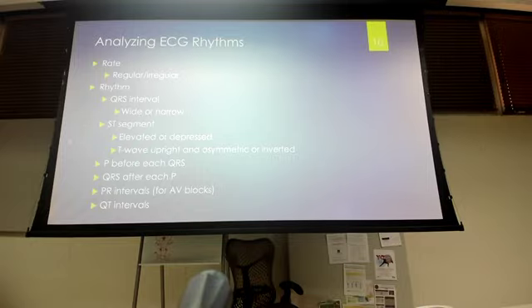For our QRS, we're looking down at that bottom 10-second rhythm strip. And then we're taking our eyes and we're moving up to the main ECG, and we're going to put likes with likes. 2, 3, AVF, 1, AVL, 5, 6. Okay, we're going to put likes with likes for our ST segments. We have ST segment elevation or ST segment depression.